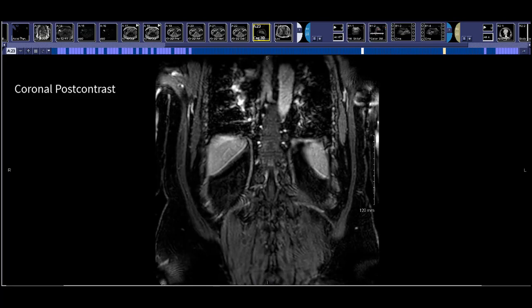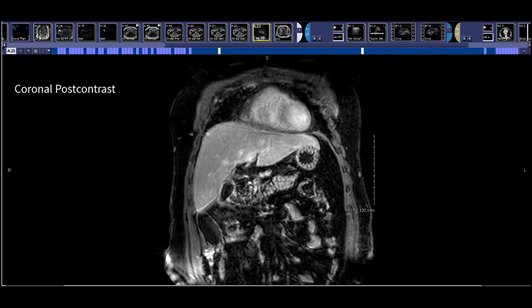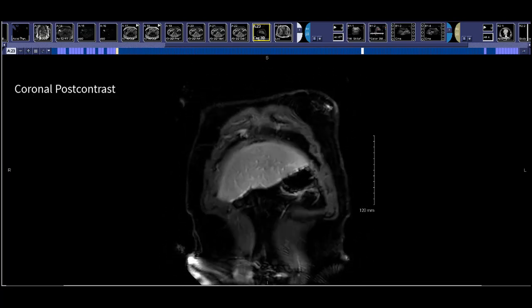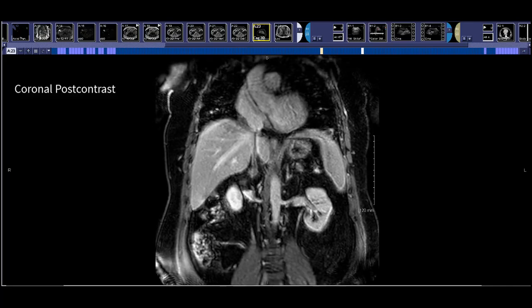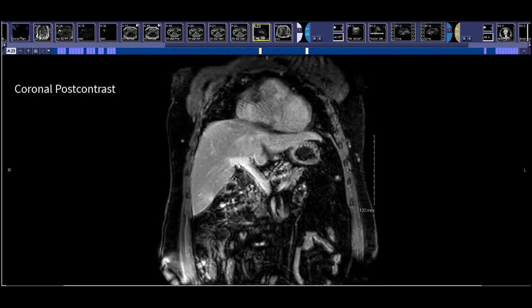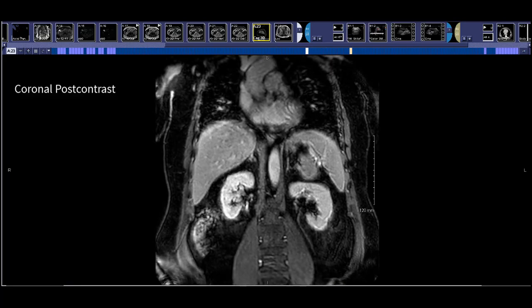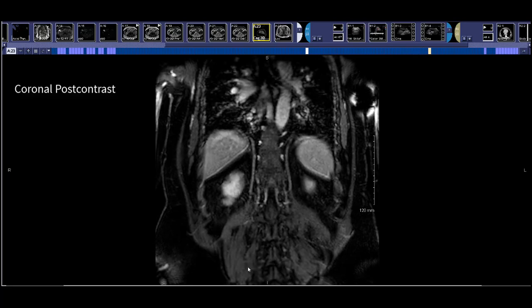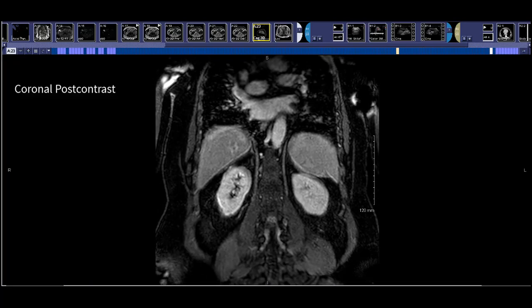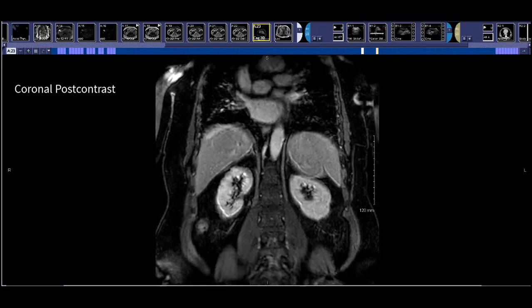In the mediastinum, you can see lymphadenopathy there, or masses. In the breasts, this is a male, but you can see a little bit of gynecomastia there. And then in the lower bowel loops, you can sometimes catch a colon cancer or a small bowel mass on this sequence. And finally, this gives us a nice overview of the osseous structures with contrast. So important to look for any enhancing bone metastases.